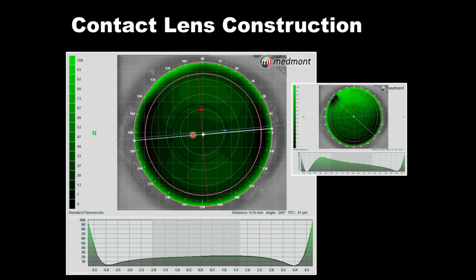On the flat meridian of the eye, the blue line that you see here, that's your flat axis measured by the topographer. Along that same line, you see the contact lens touching down the way you expect it to. If we compare that to our lens built off the erroneous topography, you'll notice that high point is really messing up how the rigid lens would land.